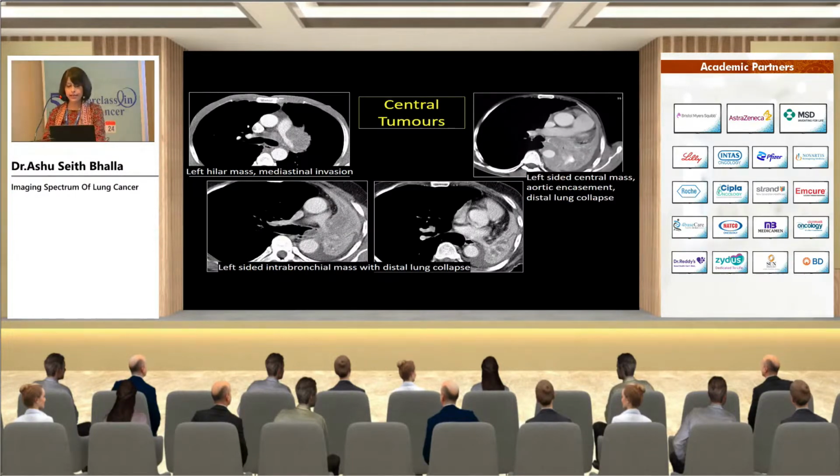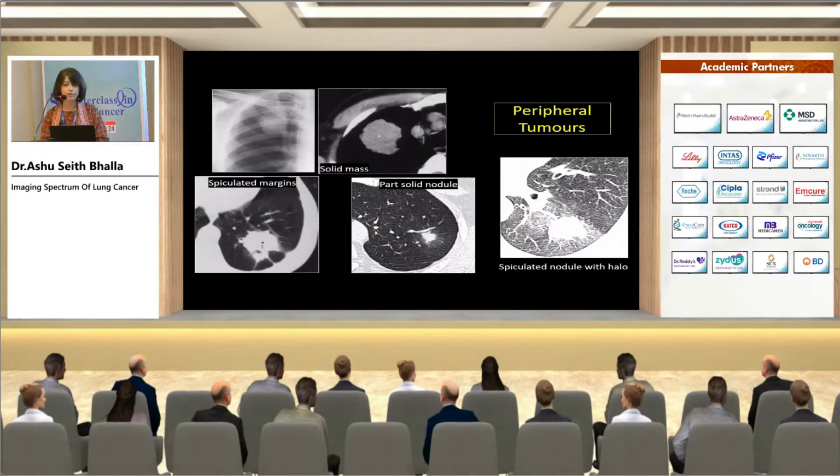And this is the CT scan illustrating pretty much the same, that you have a hilar mass, you have a lot of mediastinal nodes. When we come to staging, Mandeep will address how differentiation between central masses and nodes can be challenging. And similarly, you have distal collapse. So this is the typical appearance for a central mass lesion.